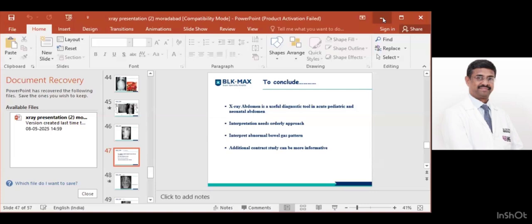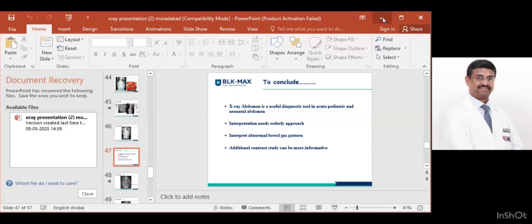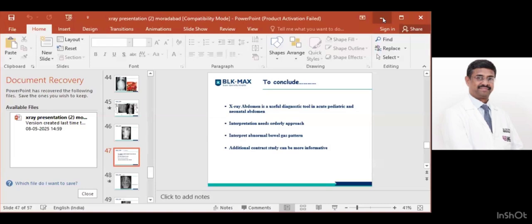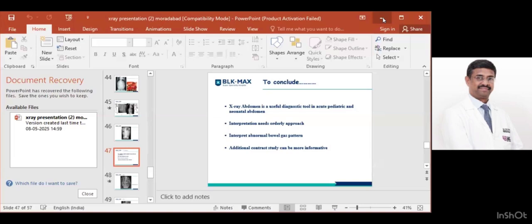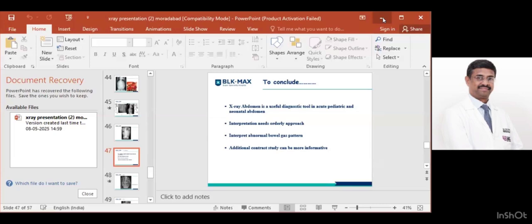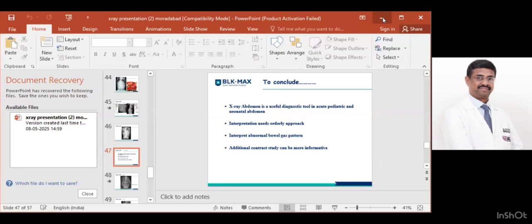Correct. And the second point was this one image that you showed in which there is colonic atresia. Yes, colonic atresia, and this image could also be similar to what we see in cecal volvulus. You can have this coffee bean appearance with the neck extending to the pelvis. Though colonic atresia would be very common in a newborn baby, cecal volvulus is not that common in the pediatric age groups and newborn patients. We don't see it much in the early pediatric age group, maybe later and in adulthood, yes, of course. Agreed. That's important.